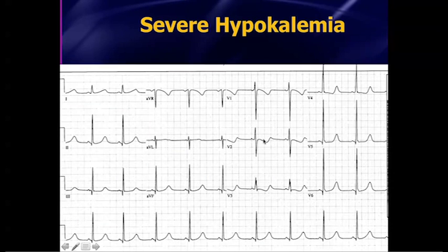And another case. Once again, this person's potassium, as I recall, was about 2.2, and you see that the T wave goes down and then upwards, and that's the U wave right there. A big, big U wave. And initially, there's sagging of that ST segment or the T wave. And out here in the limb leads, just kind of a long QT interval.